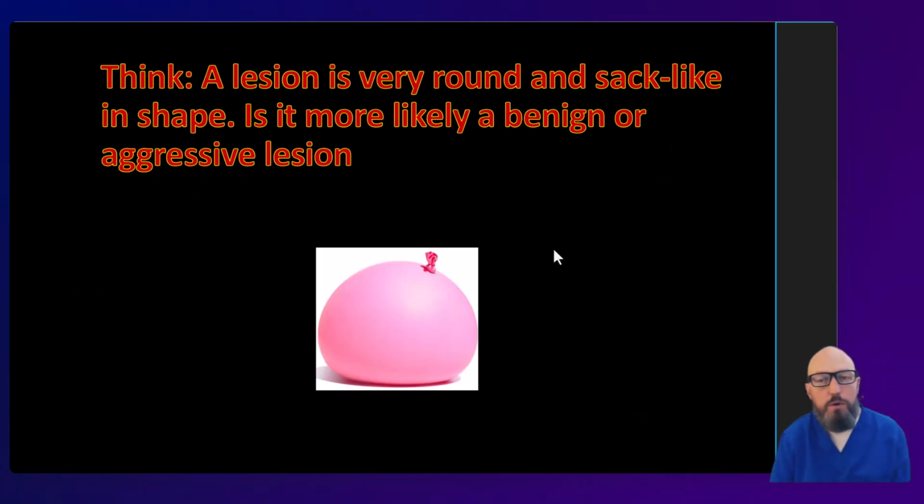And so thought question for you: a lesion is very round and sac-like. Is it more likely benign or aggressive? Hopefully you're already thinking benign. Round, sac-like, hydraulic, all of those are signs of a slow, fluid-filled, well-contained growth. Aggressive lesions don't have time to look like water balloons.